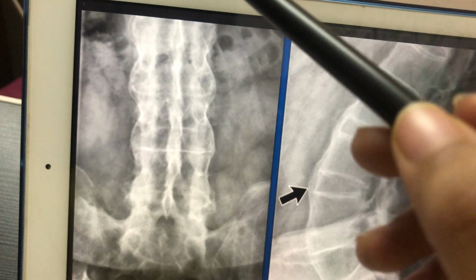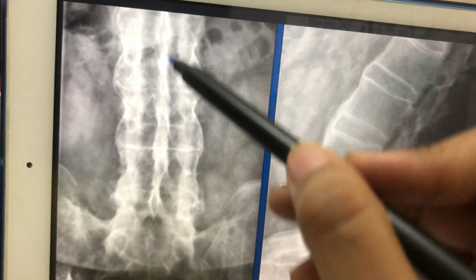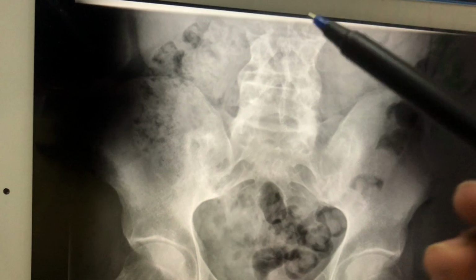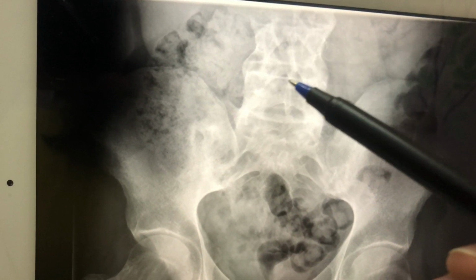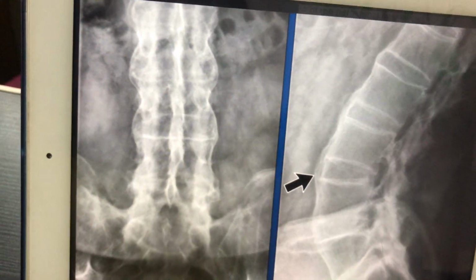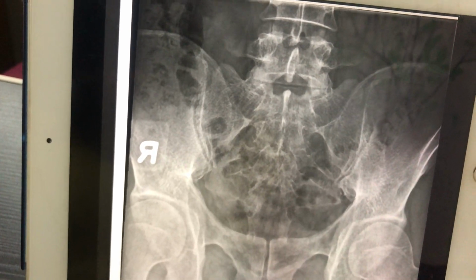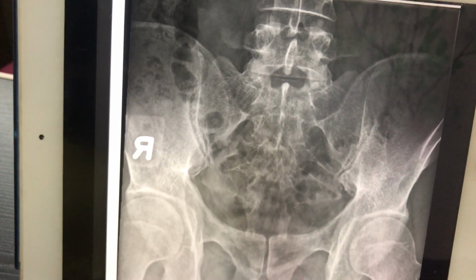Another type of calcification is this continuous osseous band that you can see of the interspinous ligament. This is called a dagger spine appearance. Now here you can see the discrete spinous processes that have no ossification between them, but here there is continuous flowing ossification. That's called dagger spine appearance. Now the third and most important thing, or rather the earliest feature of ankylosing spondylitis, is sacroiliitis.